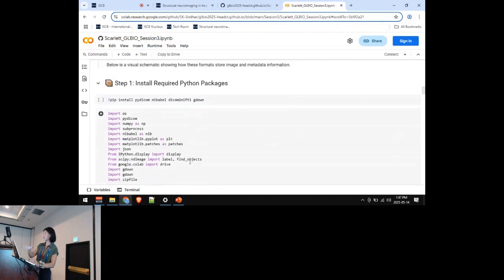Okay, so right now is the fun part, the hands-on part. All you have to do is click play. Every time we start coding, just a show of hands: do you know how to code in Python? Have any experience? Okay, that's pretty much the majority of the people.